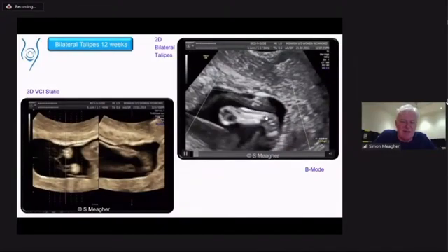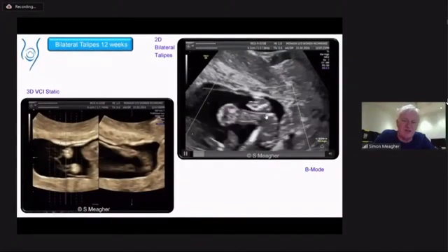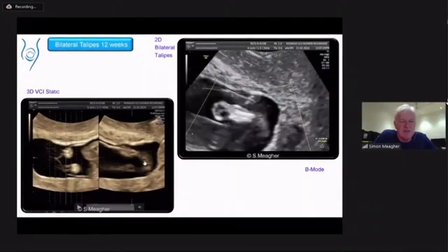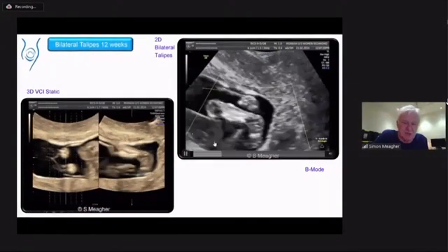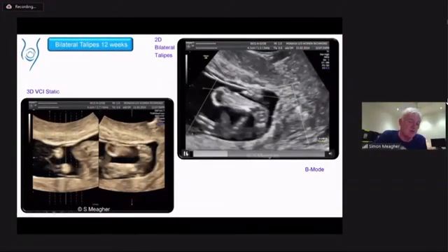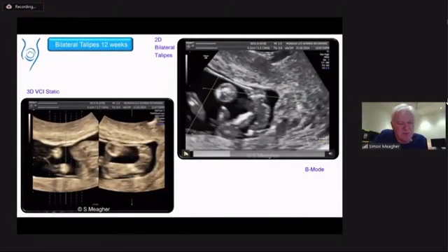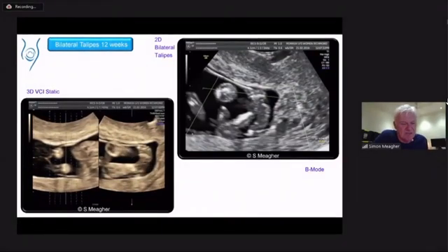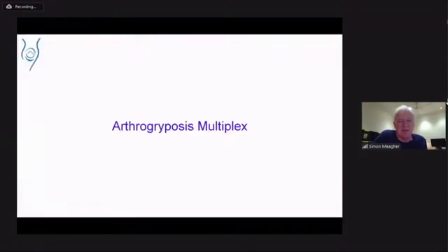Similarly, standout talipes with that tomahawk, almost like the radial ray equivalent, but the digit count, of course, is normal. And we see these for sure in the first trimester of pregnancy. Anytime you see them, of course, you go straight to the brain. But the problem with the first trimester is the corpus callosum is not formed at 12 or 13 weeks of gestation. But you can at least get some detail. But that would be the next organ system I would move to after examining the skeletal system for skeletal dysplasias.